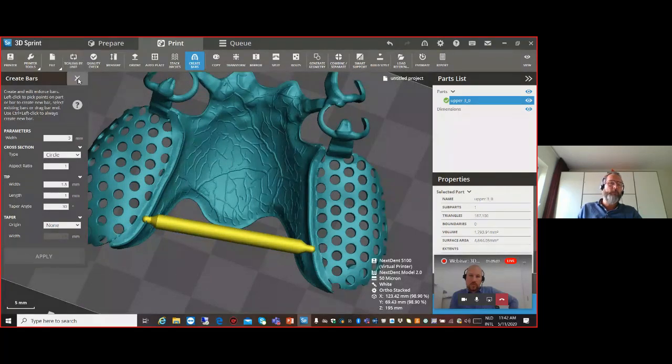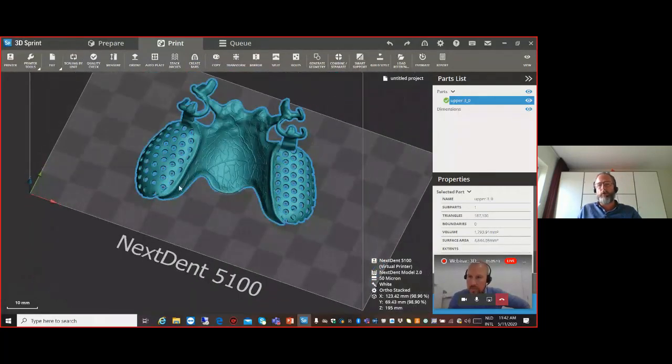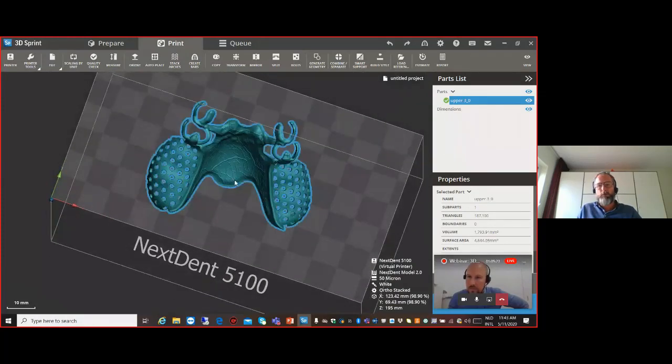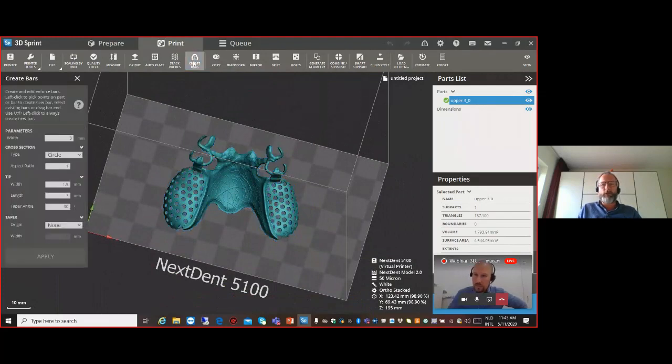I must say that I normally do not use the support bars when printing my castable parts. It comes out just fine. I've learned that these bars were there for metal printing, but actually, of course, we're not printing metal, we're printing our castable parts. And I found that without the support bars, this works perfectly fine. But if you would like to use it, it is available.